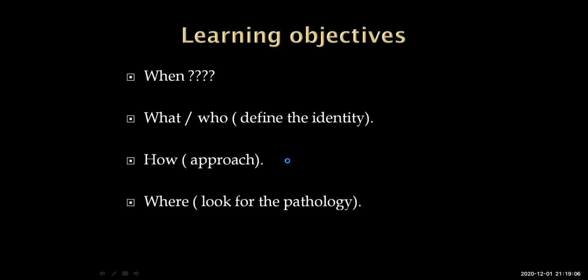I'm not a radiologist, but in a way that can help you with a knee case, how you can reach the diagnosis from the point of view of a clinician, not a radiologist. And then we're going to see, if I find a pathology, what the most suitable sites are that I should suspect.